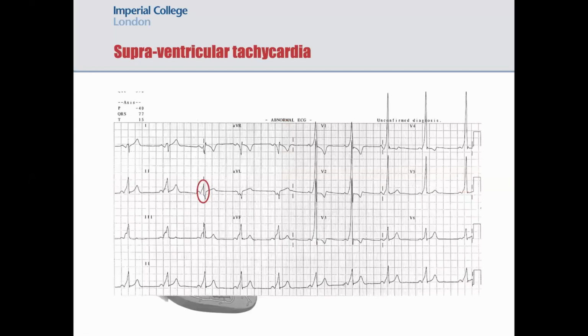It's slightly slanted. So in ECG, that's called a delta wave. And normally when you see this, it suggests that there is an accessory pathway, that's indicative of AVRT.